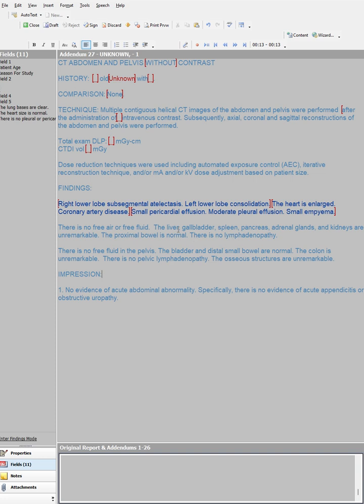For example, I was used to just saying cholecystectomy here in the findings and saying the same thing down in the impression. But if you set up cholecystectomy as a trigger word, then it doesn't know where to put it. So instead, I just have gallbladder as a trigger word for my findings section, and I have cholecystectomy as my trigger word in the impression. So for example, I would just be dictating in findings mode, and I will say surgically absent gallbladder, period, cholecystectomy, period. And it will put cholecystectomy down here and the surgically absent gallbladder up here.